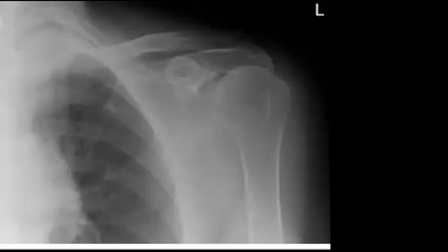And this one, I think I showed you the answer. So already, maybe you will describe something related to impingement or shoulder impingement. But look in this region, the patient already has an apical mass. So you should check carefully, because sometimes they show you this in the field, especially in the FRCR, they like this type of cases.